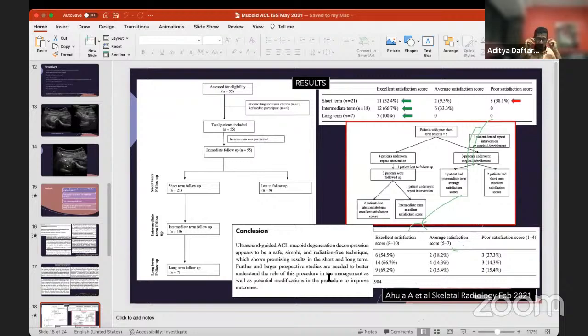You can see two things. One is you can see bone marrow edema, but also sometimes you'll see a residual effect of bone marrow edema, which is you may see a little buckling of bone. But these are slightly more subtle findings that I wouldn't really encourage you to look at, because you can tend to overcall or undercall them.